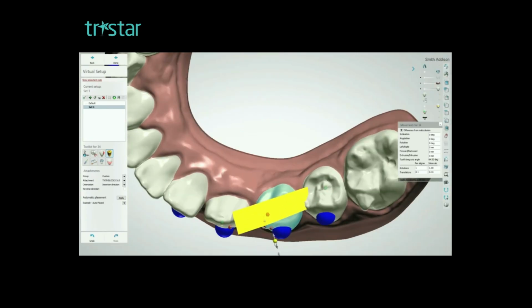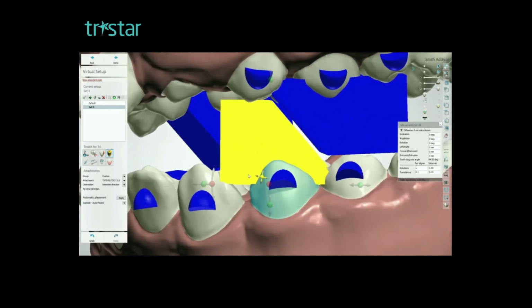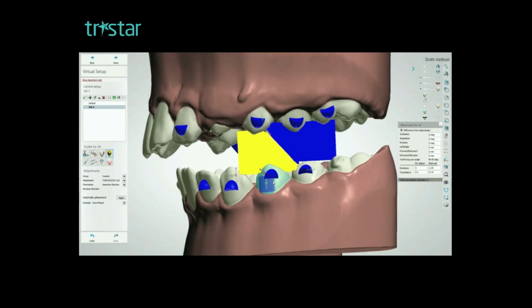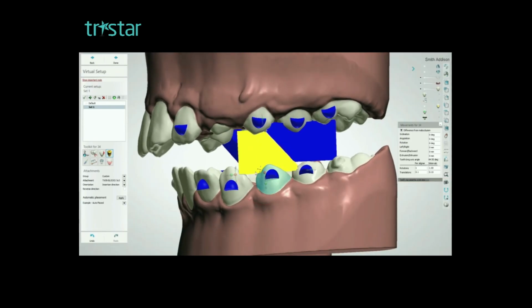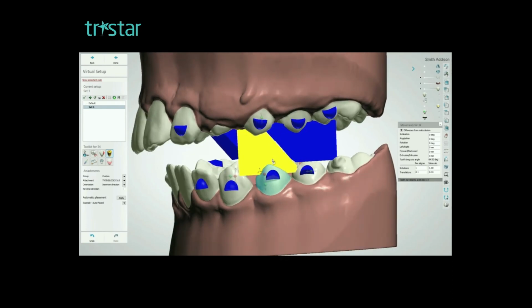We suggest an advancement of 1 mm per month. Whilst waiting for advancement, the upper and lower twin block aligners can perform tooth movement such as Broadbent staging. We did not show tooth movement procedures here in order to increase the clarity of instructions for twin block design only.